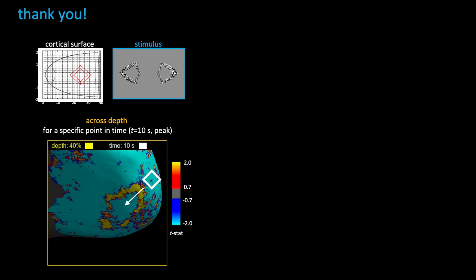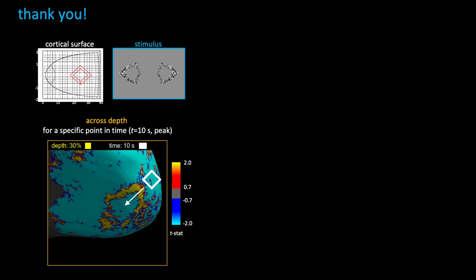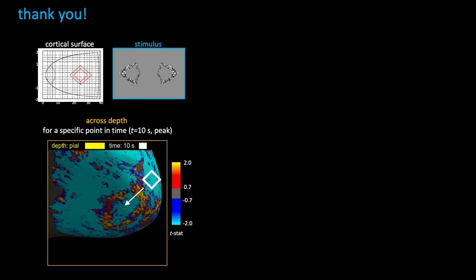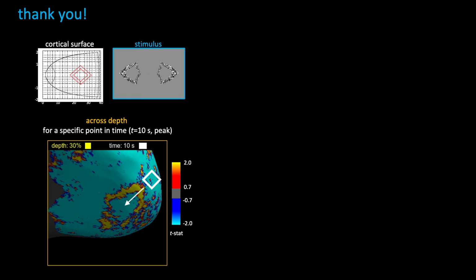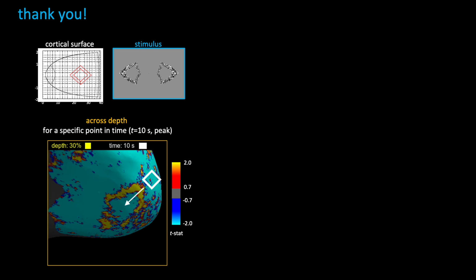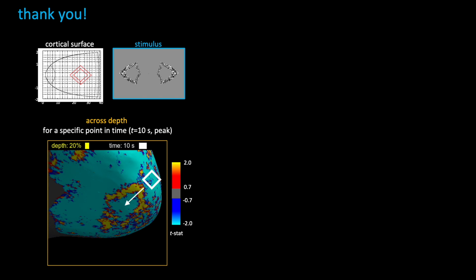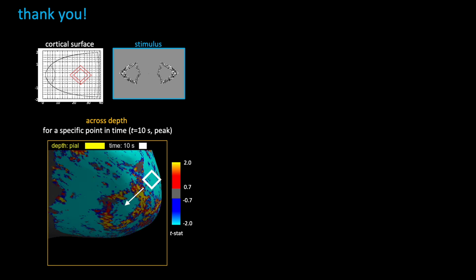And with that, I would like to wrap up by showing you very quickly, since we are running out of time, a movie from the work that we did a few years ago, showing the evolution of the response to a retinotopic stimulus across cortical depth. It's a selected time point, and the movie is basically going from white matter to the pial surface, and we can really nicely use this surface-based approach to look at the change of this activation in this way.